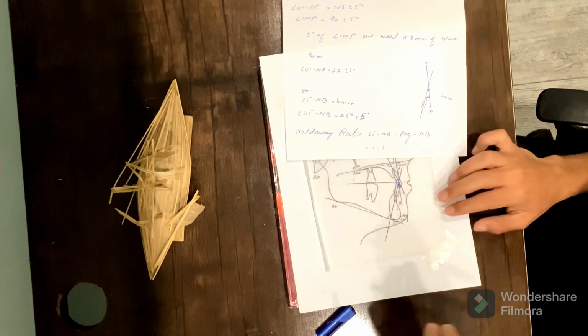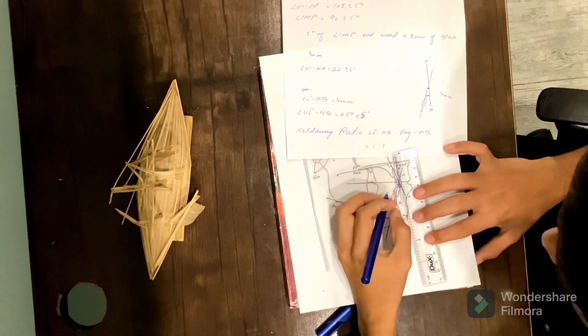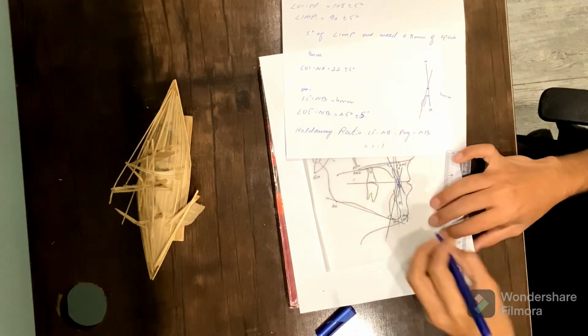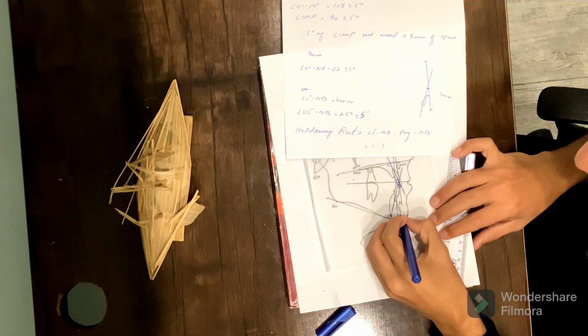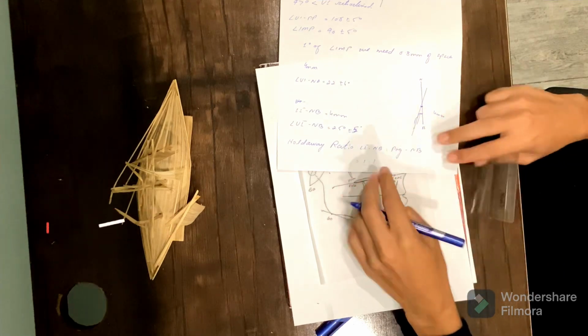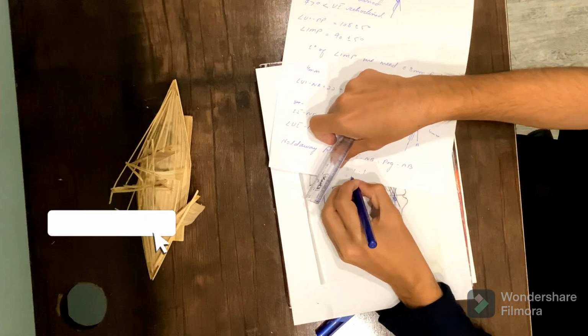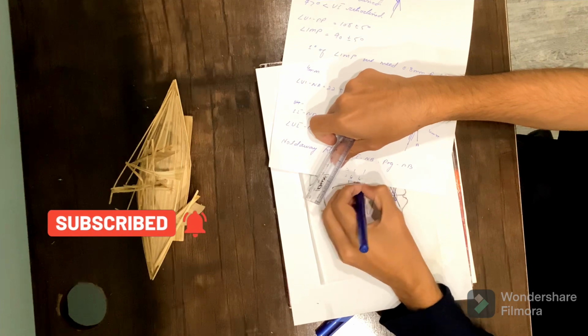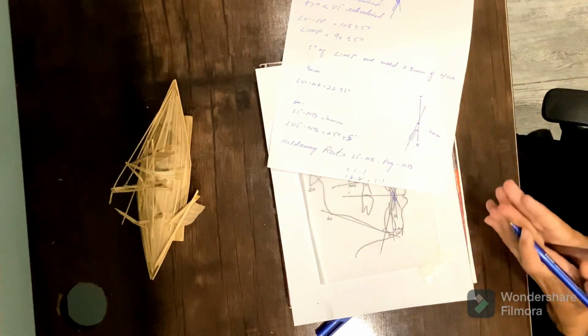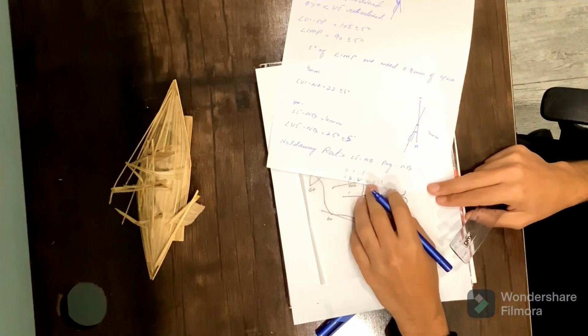If this is the NB line, the distance between the NB line and pogonion and the distance between the lower incisor and the NB line should be 1:1. Either it should be 4:4, which cancel out each other, becoming 1:1. So they should be equal to each other.